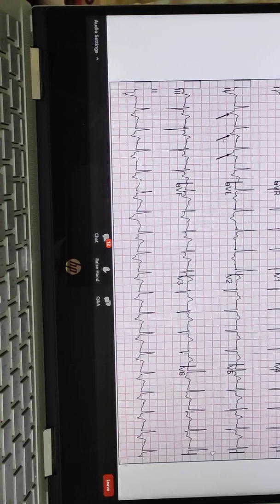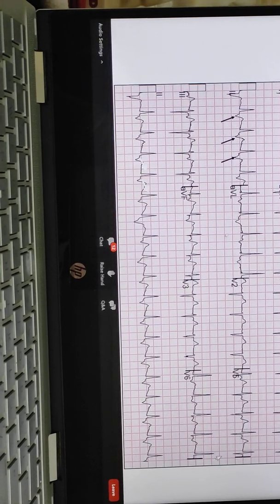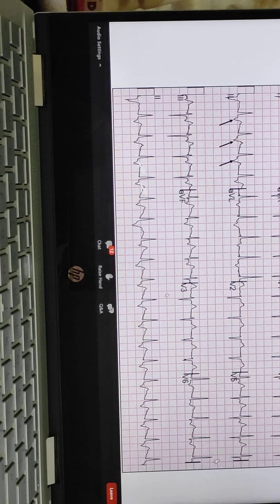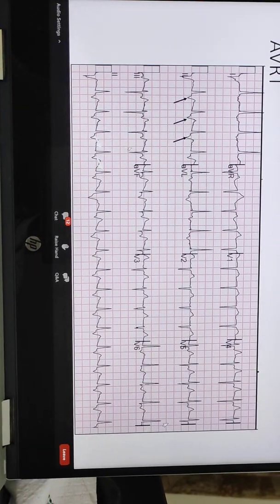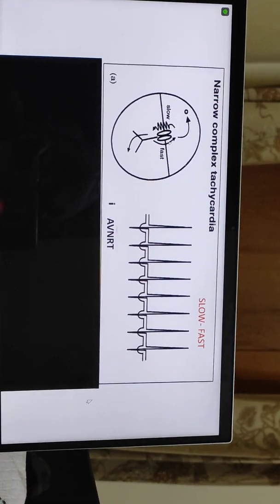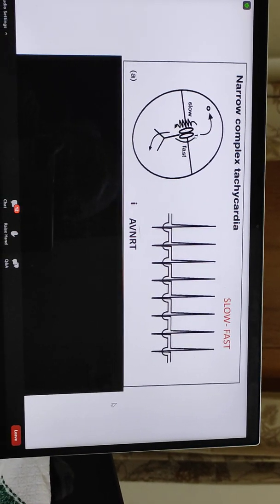So just to impress people, during the tachycardia itself we can say, when you take this patient, revert, and take this patient's normal ECG, you will have a WPW syndrome pattern, and people will be astonished by your ECG knowledge. So just keep looking for this inverted P wave in the ST segment. Whereas the next most important commonest narrow QRS complex tachycardia is AV nodal re-entry tachycardia.